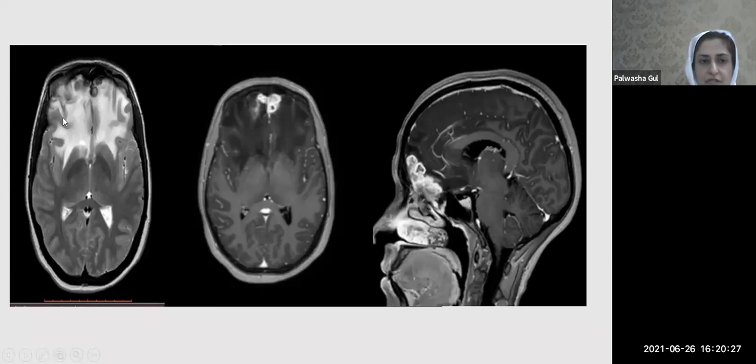There's loads of edema. And on sagittal, we could see that this area of enhancement was also there in the ethmoid sinuses and going to the frontal lobes. So this was actually a case of a fungal infection going from sinuses to the brain and causing cerebral abscesses with ring enhancement. The patient also underwent biopsy, and this proved to be aspergillosis.